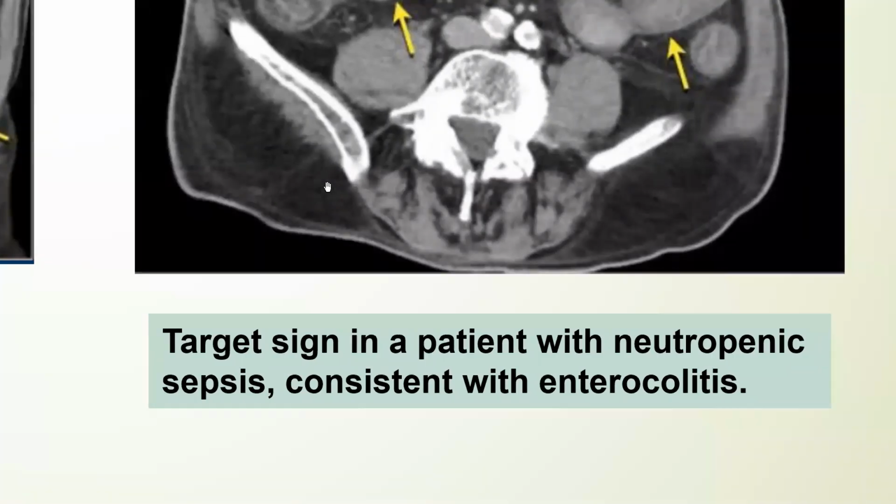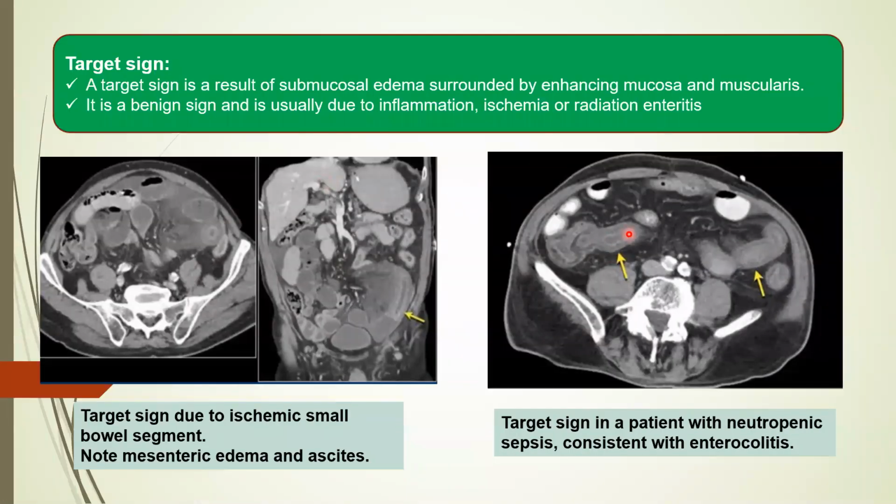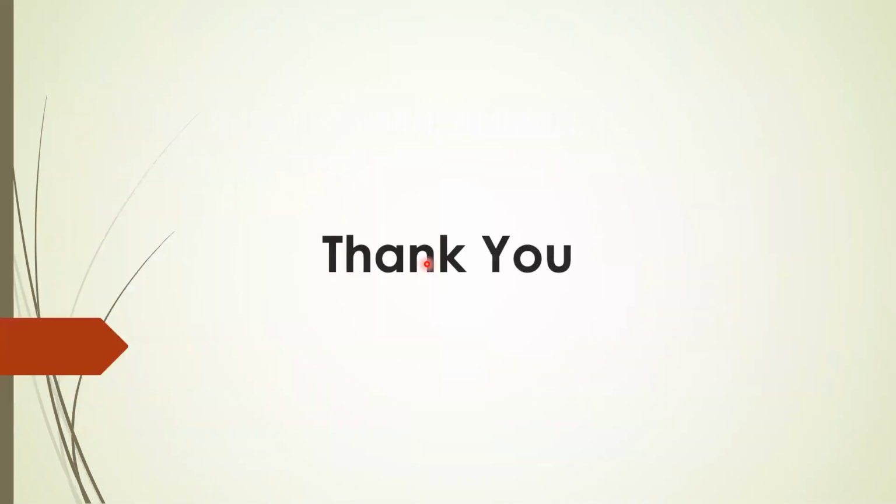In this case of enterocolitis, the target sign is very clear here, and this case is bowel ischemia. Also, you can see the target sign here. And thank you.